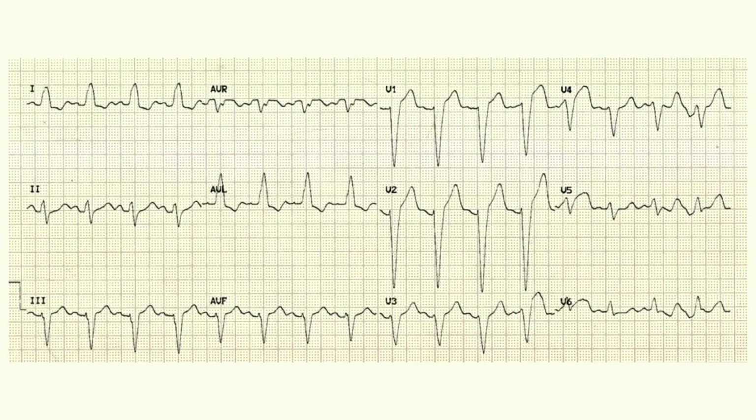Okay, then you see this one. I show you these because you may recognize the easy, obvious ones, but the point is that sometimes bundle branch blocks are atypical, so this is, I think, a useful framework to think about it. So in lead 1, the terminal QRS, is that positive or negative? It's positive, so current is traveling to the left.